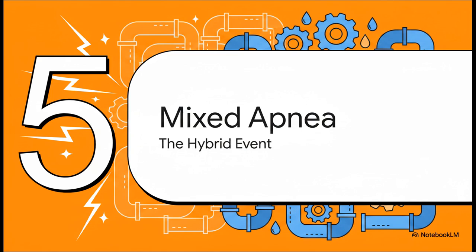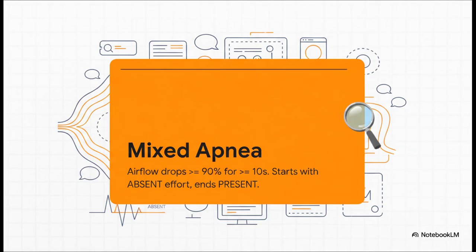Which brings us to Section 5, Mixed Apnea, the hybrid event. As the name kinda gives away, this is a hybrid. It's an electrical issue that transitions right into a plumbing issue, all during a single pause in breathing. To score this, we're still hunting for that total airflow drop of 90% or more for at least 10 seconds. But the effort channels, they tell a two-part story. The event absolutely must begin with absent respiratory effort, and it has to end with present respiratory effort, all while that airflow stays completely blocked.